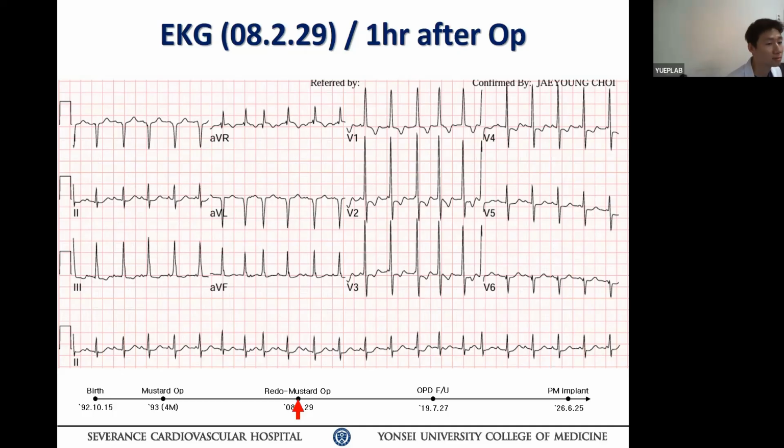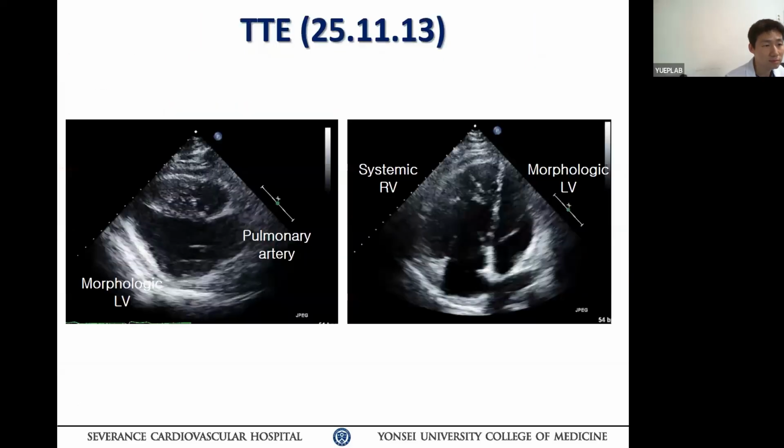So you mean junctional tachycardia? Junctional tachycardia is also common just after cardiac surgery in pediatric patients. So you implanted a pacemaker? Yes. Where did you hook up the A lead and V lead? I implanted the atrial lead into the Bachmann area, the Bachmann bundle area.